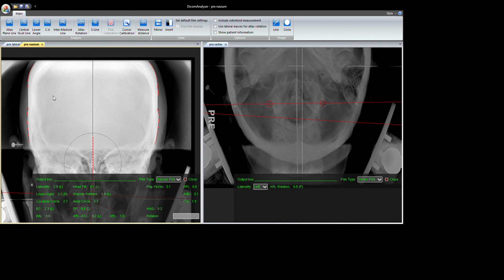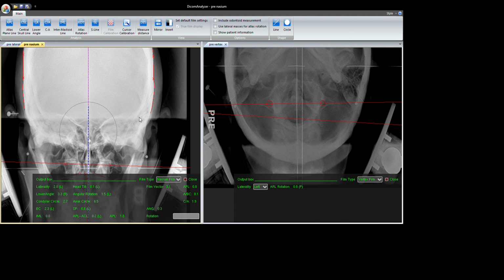If you can't get the same numbers, it's probably because you marked the edge of the skull poorly, and you might need to go back and redo that. And so if I was going to redo that, I would just say no when it pops up and says, would I like to use the old left and right skull curves? And then I would have to redraw those. And often if I'm doing that, I'll redraw them out of the way so I can do it once more and draw them cleanly off of a fresh palette.